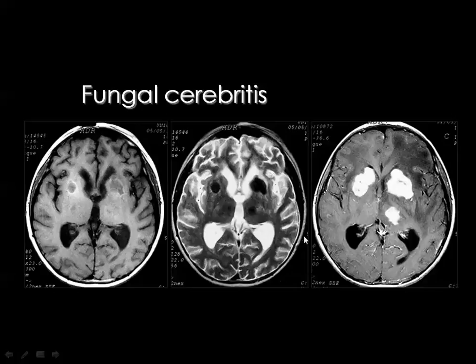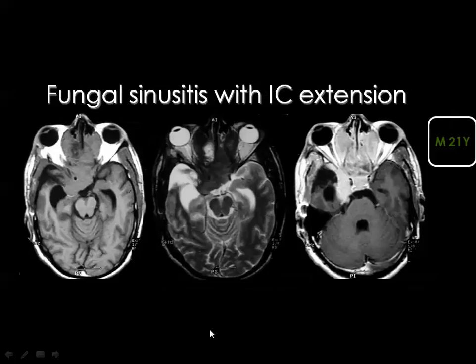characteristic criteria. But if you look here and you see an intermediate lesion in the T1 with this very dark lesion in the T2, you may suspect the presence of acute brain hemorrhage. But this post-contrast image will lead you to the correct diagnosis, since hemorrhage does not enhance with contrast material, and the fungal lesions will show this significant pattern of enhancement.